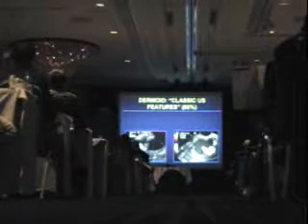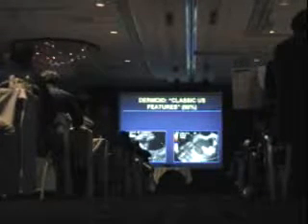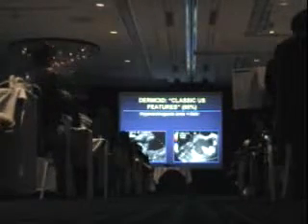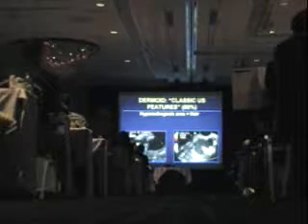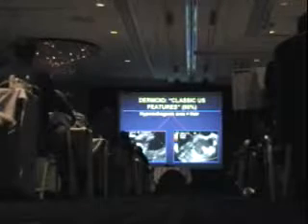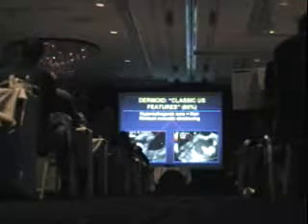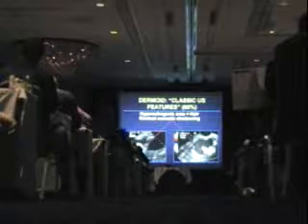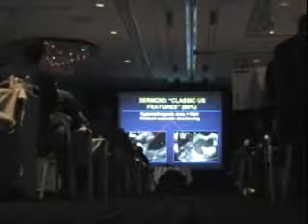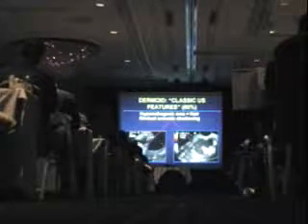It's important to recognize what dermoids look like because most of them look like a variation on a pretty typical theme. And that theme is, knowing what's causing the echogenicities and the lucencies, a lot of people call this fat, and that's not fat. That is hair in a dermoid, and it has gradual acoustic shadow. It's like a hairball. You ever have your cats, you know what I'm talking about when you say a hairball. Well, that's what that looks like.